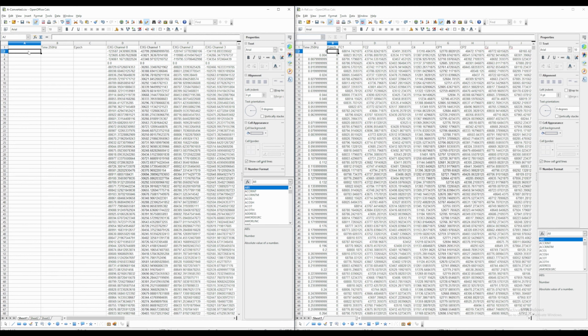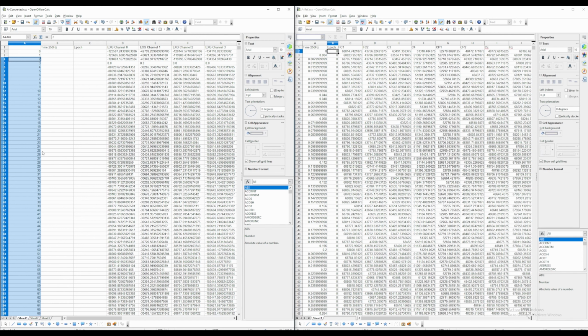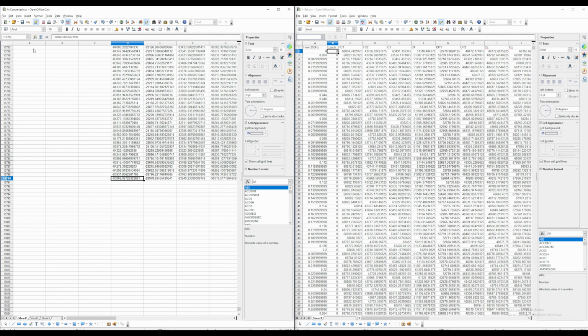And in any spreadsheet program, you can just write a series, and if you pick the last one and click and drag that corner down, you get the rest of it. But it's going to be difficult to drag it all the way down if it's a large file. So I'm going to show you how to navigate it. You can use Control and arrow keys to jump to the next element in the table. So left, right. And if I press down, it jumps to the last contiguous element in this column.